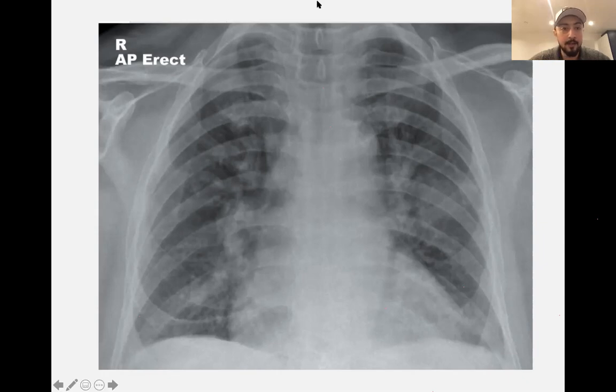Okay, if we look at the penetration, you can see the vertebrae. So that has, I would say, good penetration as well, although you don't see them properly at the bottom, but that's fine. Now, if we start with A, B, C, D, E, so if we start with A, you can see the trachea in the middle here, okay? And I don't know if you noticed, but that is the left main bronchus, and here's probably the right.